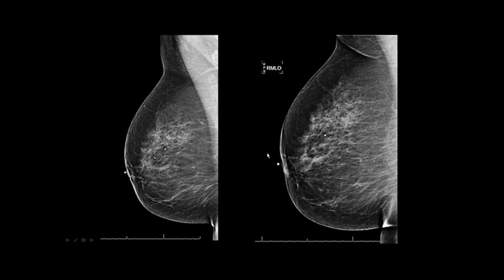So that's why it's small and large. And I've heard technologists say, well, my radiologist doesn't like us to use a larger paddle because it is a smaller image. And I understand that. But if the patient doesn't fit on a small paddle, they have no choice but to go to the large paddle. And this is a fine example of that.